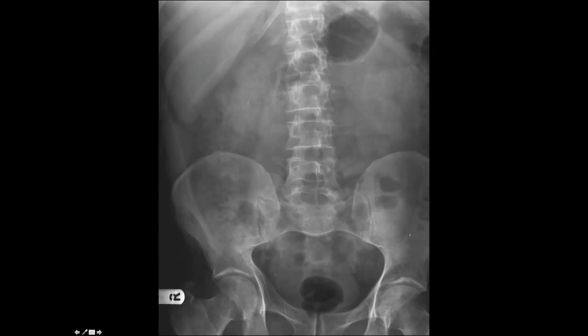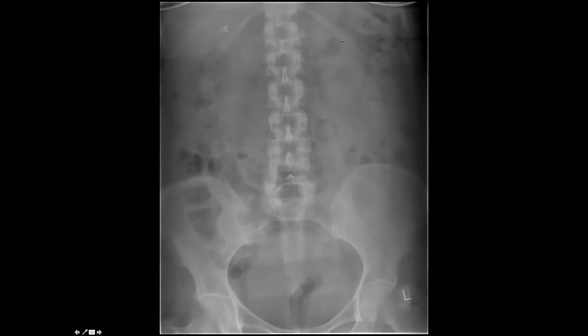Okay, so this isn't constipation, is it? Constipation is a symptom, isn't it? Yeah, and that's why we don't do an abdominal X-ray for diagnosing constipation. And this is the rectal gas here. Again very much normal. And seeing this amount of fecal loading is quite normal, isn't it? Yes. So that's again normal, no additional opacities. But the important thing is it looks a bit different from the other normal one. That's correct. Okay, and moving on to the next one.